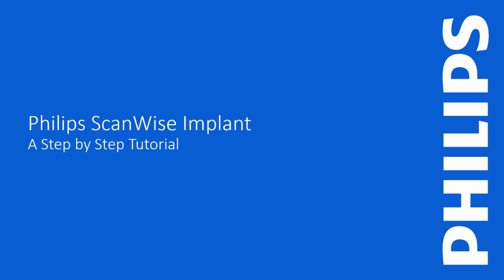Philips ScanWise Implant has been around for many years. I want to show you how easy it is, though, to scan MR conditional implants using ScanWise Implant. This allows you to input the limitations of a specific implant as specified by a manufacturer up front before you start scanning, and each of your sequences will be automatically adjusted, as opposed to the old way of adjusting sequences individually.